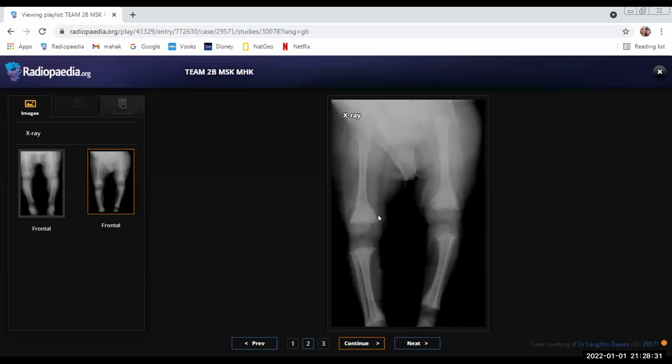with the Pelkan spur. I would discuss the findings with the clinician and ask for the vitamin C levels to confirm the diagnosis, and the patient would be referred to pediatrics for further treatment.